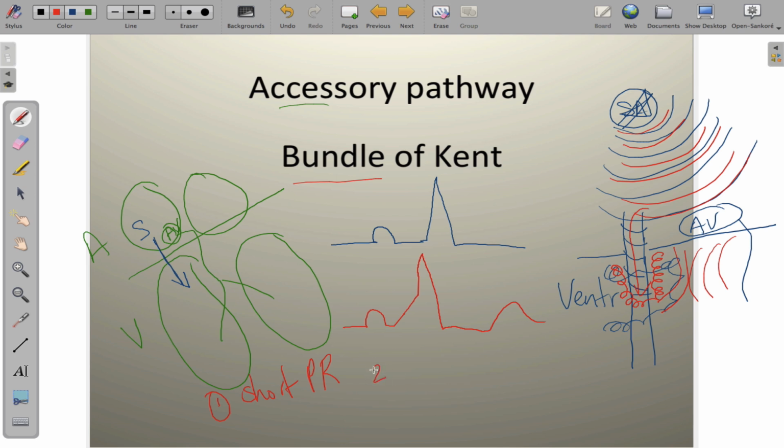Second thing that happens is that the QRS begins to widen. So this should make sense. As you lose PR interval, you've got to give it somewhere, so you give it to the QRS complex. So you'll see the PR segment is short here, and the QRS complex has widened as a result.